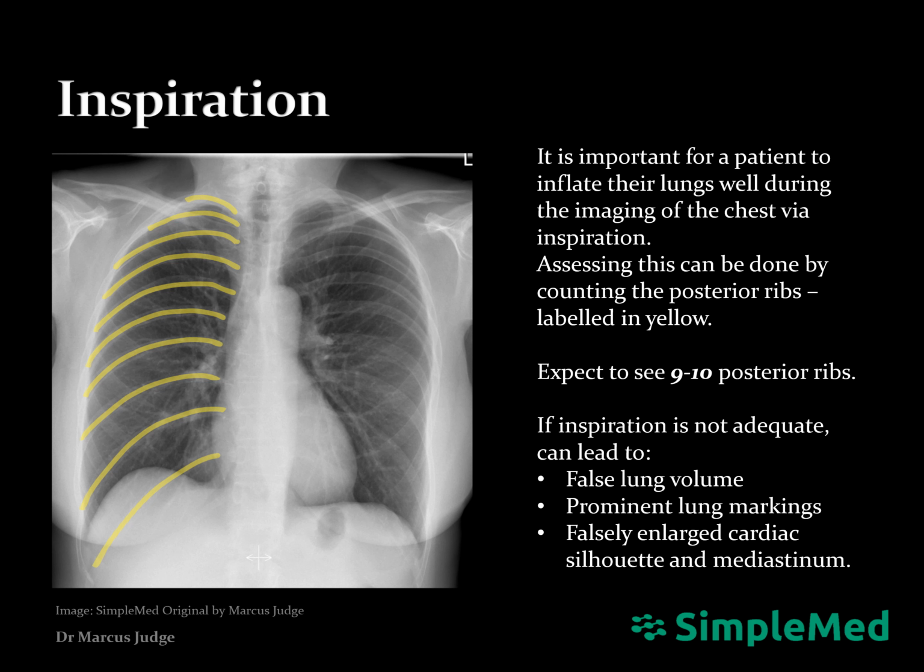When taking an X-ray, the patient is asked to take a deep breath in. This inflates the lungs and allows the bases of the lungs to be visualized properly, as well as giving a better idea of lung capacity. Seriously ill patients and those lying in bed can really struggle to inspire adequately, meaning sometimes signs, particularly at the lung bases, can be missed.